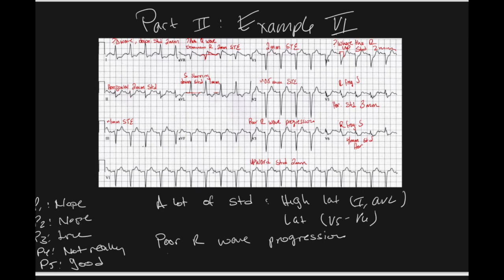Seems that we have some ST elevation in V1 and V2, although they don't quite meet criteria. A little bit in lead 3, it seems. So quite a lot going on with the ST segments in this 12 lead. Good job.